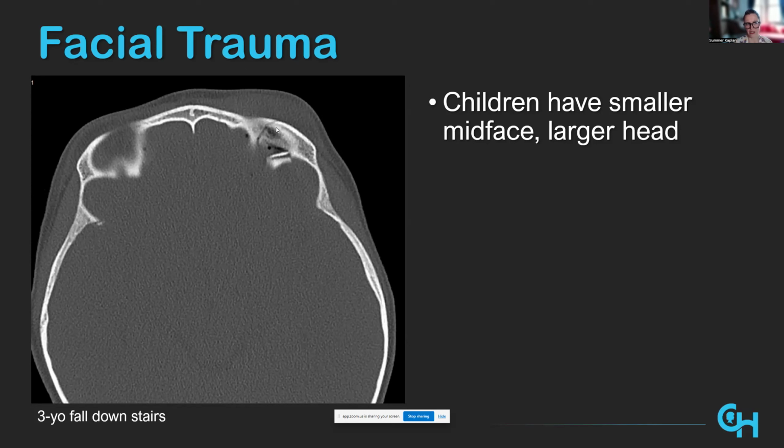So it's important when you have a facial trauma in a child to make sure to pay attention to the superior orbital rim and the frontal bone, because you can have some difficult to detect fractures there. This is less difficult to detect with the air in the skull as well, air intracranially. Soft tissues can help you. So you see the soft tissue swelling here.